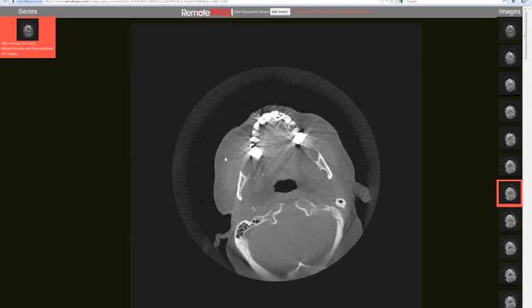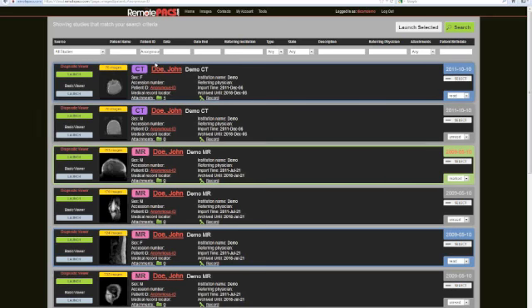It's also good in the exam room if you just want to pull up something and point out to a patient, now here's where I saw this, and you just want to do it really quickly. I'm going to go ahead and close out of the basic viewer. I want to come back to the work list here, because what we give you are a few additional features in this work list area.